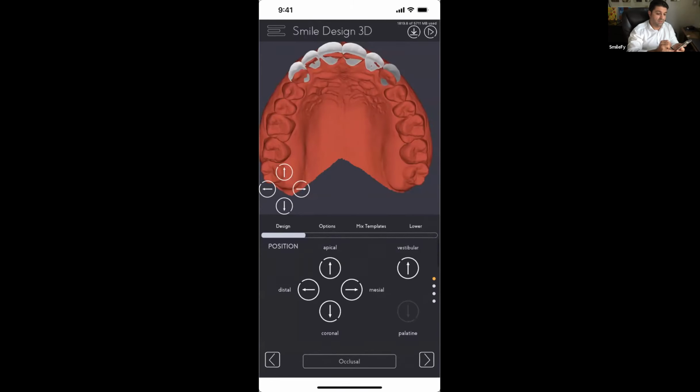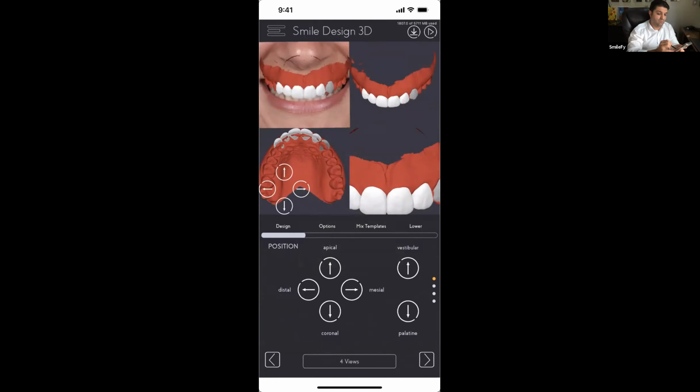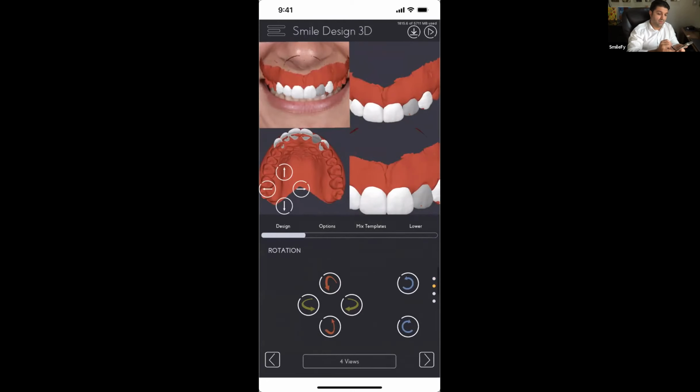Let me check. Yes, okay. I'm gonna go on 4 views. Okay, 4 views is good. I like it. It's good. A little bit more. Yeah, it's good.